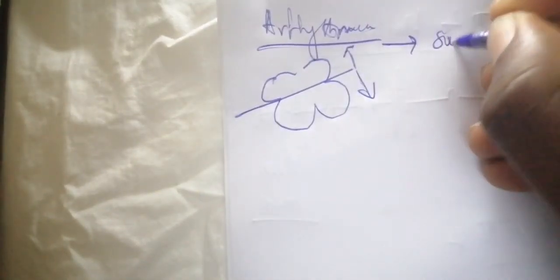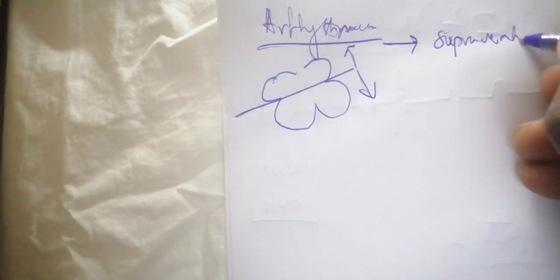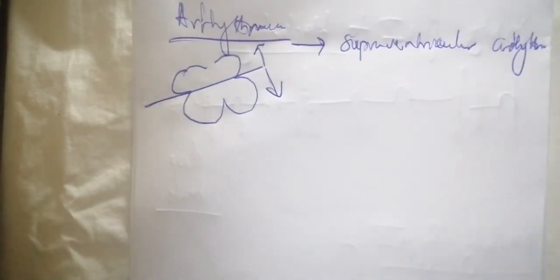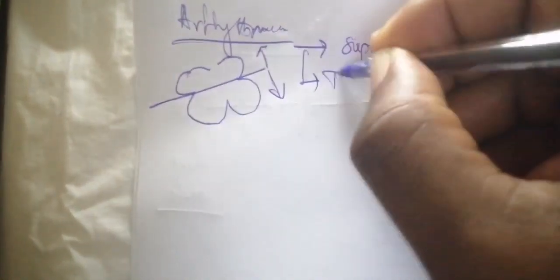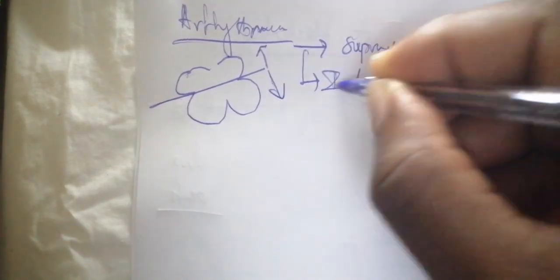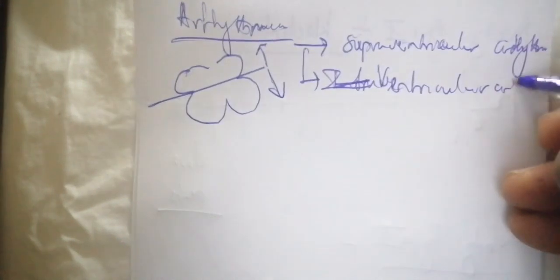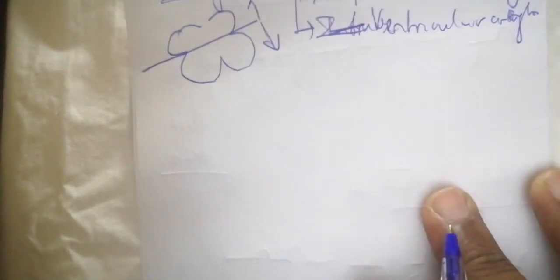Is it clear? Generally, the supraventricular arrhythmias come from everything that is above the ventricles. So I will just specifically call this tachyarrhythmia, because the bradyarrhythmias we have visualized in the conductive disorders, and the tachyarrhythmias are going to be visualized in this part of the thorax. So you have supraventricular arrhythmias and you also have ventricular arrhythmias. Now, those are the different things that you have to visualize.